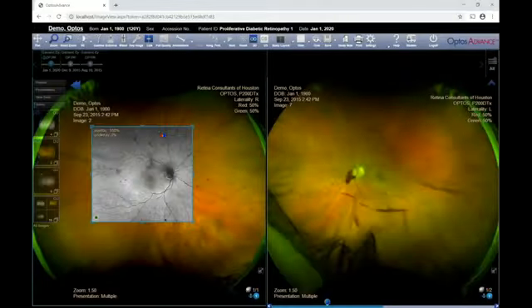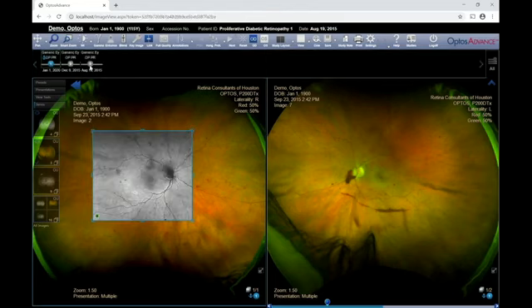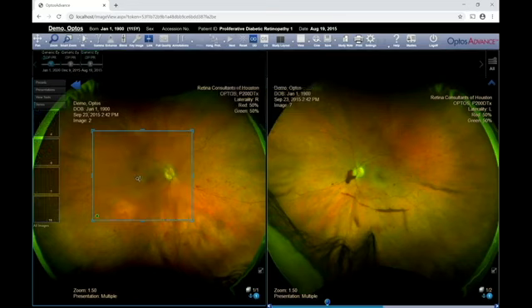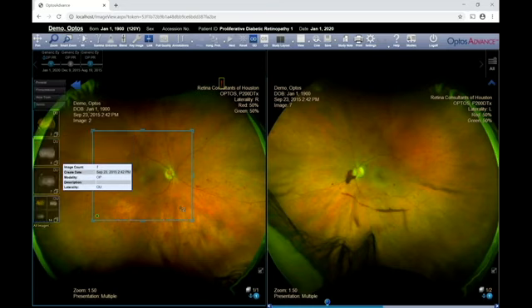If the patient has had prior imaging sessions, these would be displayed in a timeline in the upper left-hand corner of the screen and could be dragged into the Smart Zoom overlay as well for comparison. Once a prior visit is dragged in, the series thumbnail on the left sidebar would reflect the prior visit. You can fade through the overlaid image by holding down the scroll wheel and moving the mouse towards the screen and away from the screen to change transparency of the image and visualize change over time.